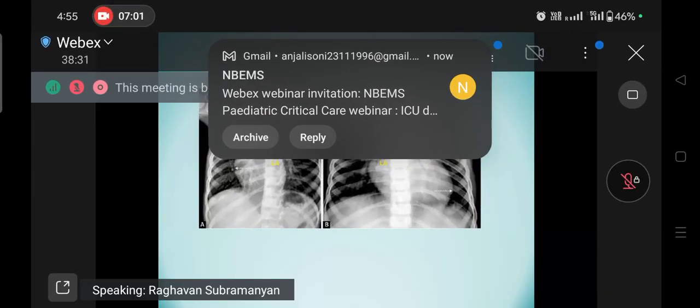On the other hand, the X-ray on my left, you see that if you put two fingers on the medial end of the clavicle, the distance from the midline is quite uneven. That means the patient is twisted to one side and it is an oblique view. Here it appears that the right side is markedly enlarged and there is hardly any heart on the left side of the spine. Therefore, this doesn't give you a true impression of the cardiac silhouette or the cardiac size.